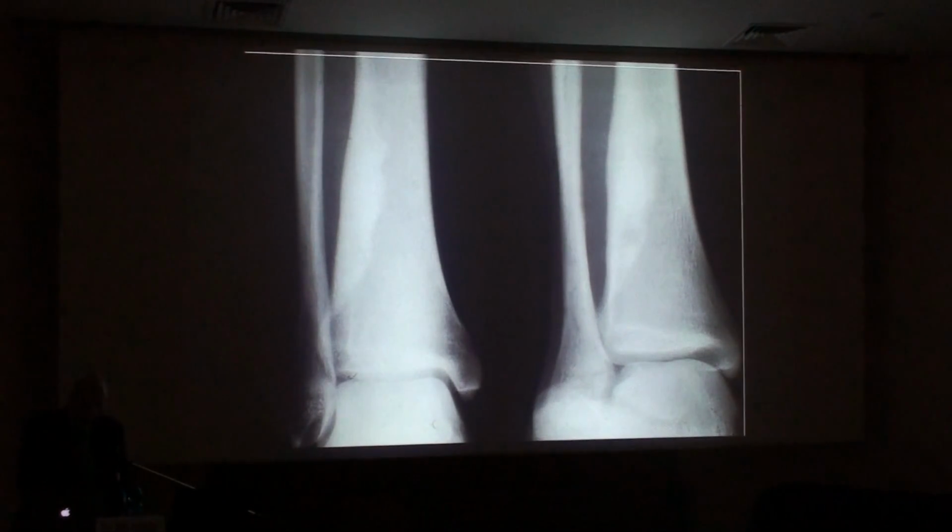Those of you who do a lot of musculoskeletal imaging will recognize this as an ossifying, non-ossifying fibroma, or perhaps better termed a sclerosing fibroxanthoma, and you'd appreciate the lobulated pattern at its periphery and the mild expansile remodeling of the cortex in this cortically based lesion, quite characteristic of it.